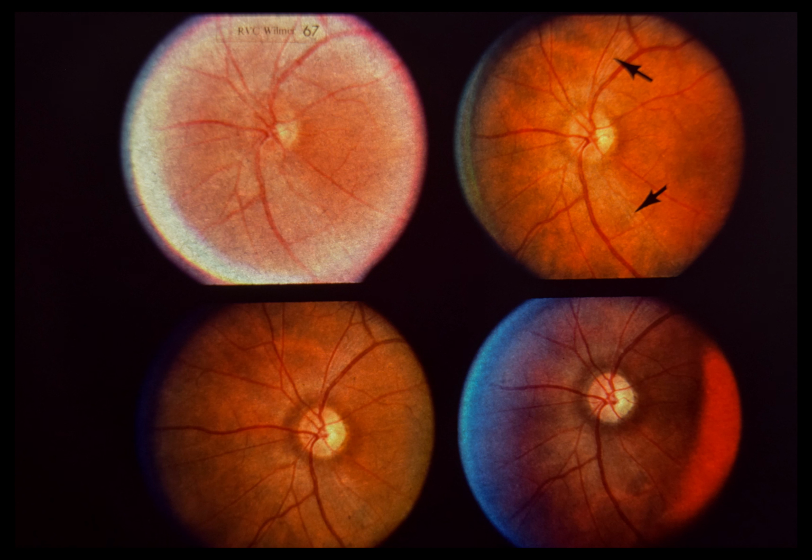Lower left. 6 months later, visual acuity has returned to 20/60 in the left eye, with a small central scotoma. In spite of visual improvement, the left optic disc shows increased temporal pallor. Lower right. 1 year after initial visual loss, visual acuity in the left eye is 20/60 and there is prominent optic atrophy.